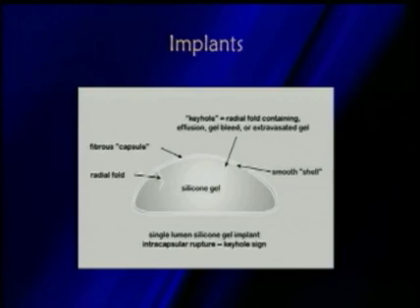Now, in looking at implants, we can have radial folds that we may see within this, sort of a smooth shell.